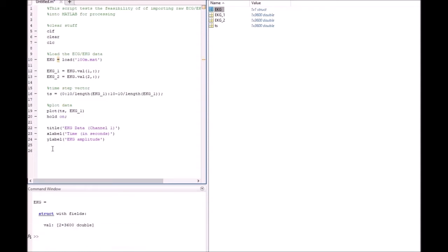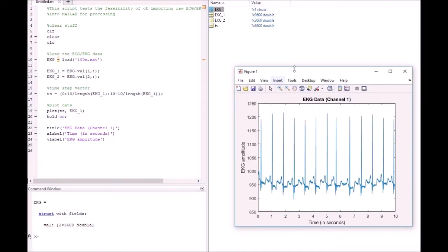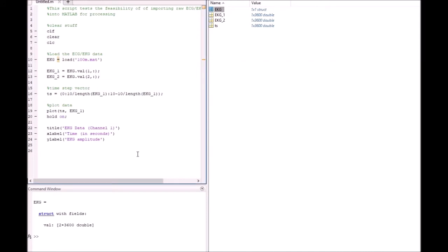So now what we want to do is try to get a count of how many heartbeats have happened. One way to do this is to just give a threshold. Let's look at this data here. We've got 13 peaks, so we need to find 13 peaks. There are lots of little peaks inside here. So if we just run the normal thing, normally you'd use findpeaks. See, MATLAB's very friendly that way. So we have pks. This is actually from the documentation.